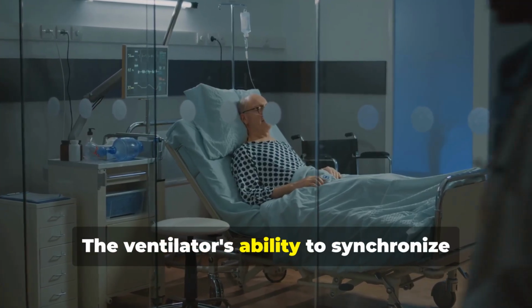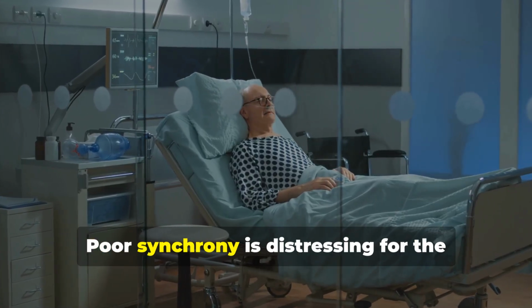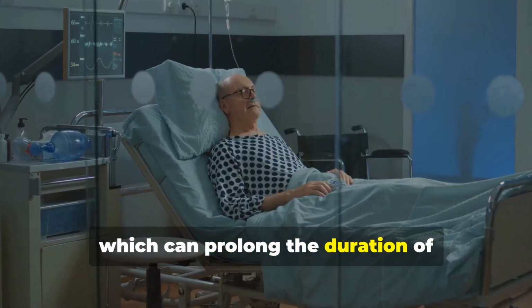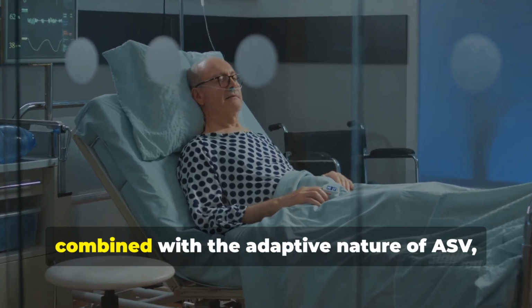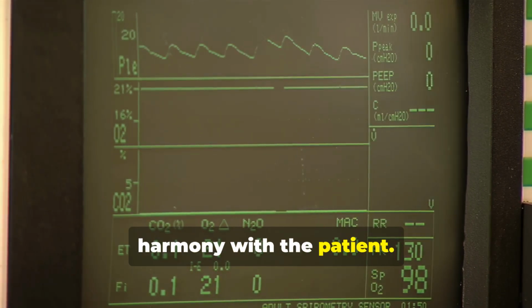The ventilator's ability to synchronize closely with the patient's own respiratory effort is paramount. Poor synchrony is distressing for the patient and often necessitates deeper sedation, which can prolong the duration of mechanical ventilation. The G5's highly responsive flow and pressure triggers, combined with the adaptive nature of ASV, ensure that the ventilator works in harmony with the patient.